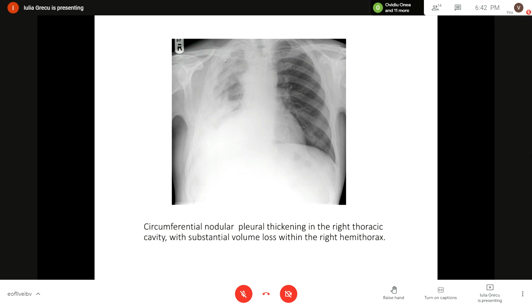This is a sign of presence of soft tissue in the pleural space, which is highly specific of mesothelioma. Mesothelioma diffusely affects the pleurae. You can also have bilateral lesions. It is frequently associated with asbestos exposure. They are usually malignant and can have a very poor prognosis.